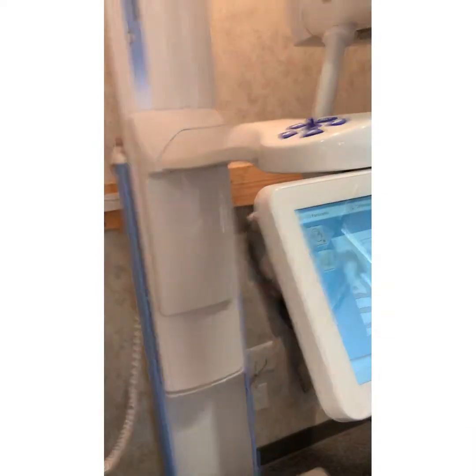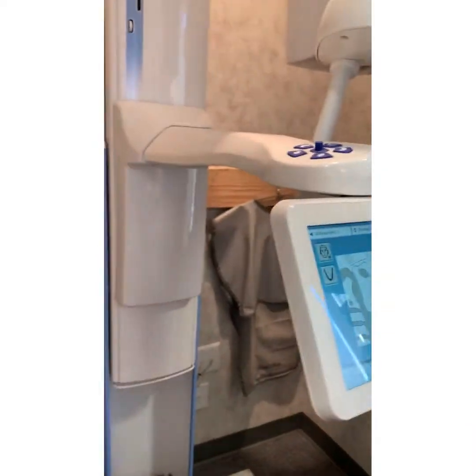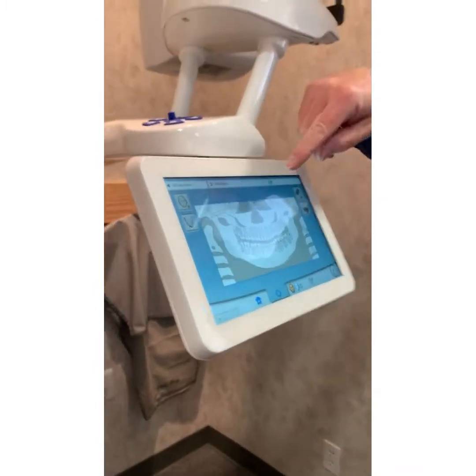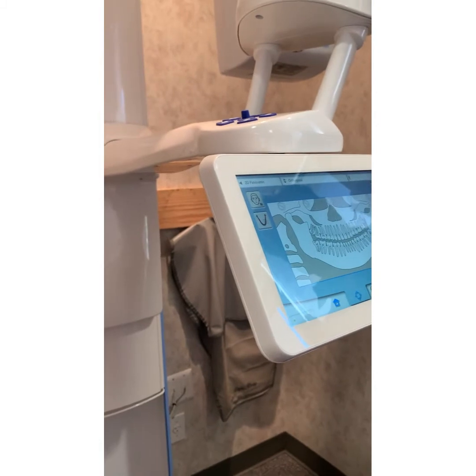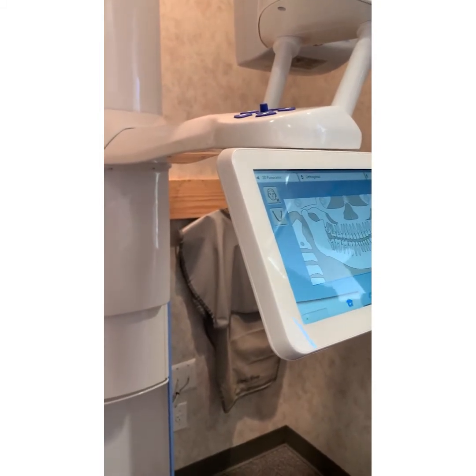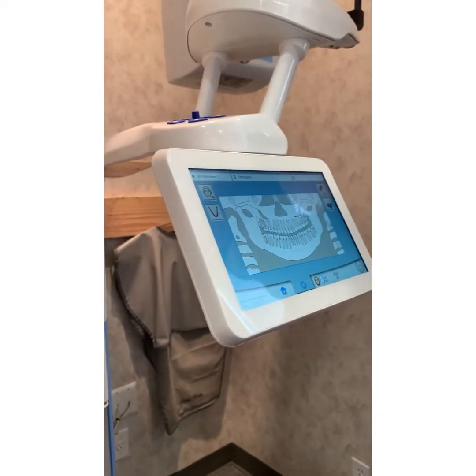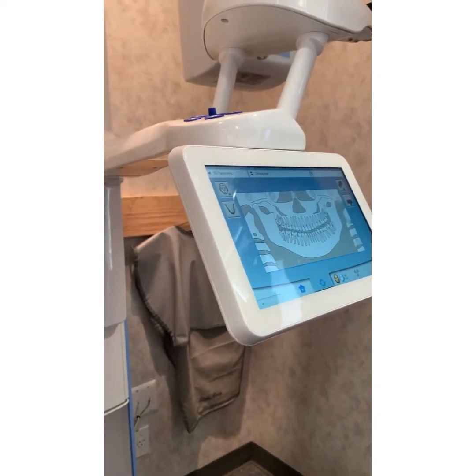I don't know if you guys realize how pans are captured. They capture this side, they capture this side, and they stretch it out. Hence, you got spine on both sides and condyles and the whole 9 yards. Orthogonal captures the pan a little bit differently by cutting it up into thirds. And how that avails you guys is that it helps minimize the shadow casting. What happens when you have an earring here? Yeah. It shows up here, here.